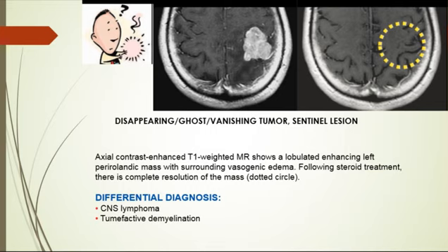The enhancement pattern is homogeneous and solid in immunocompetent patients, but more heterogeneous and ring-like in immunocompromised ones. So if it's ring enhancing, ugly looking, it's more in favor of immunocompromised. If it is nice, smooth, homogeneous, it's more likely immunocompetent, especially after the 5th decade. The lesions can be multifocal and can involve the brain parenchyma, vessels, ependyma, and meninges.